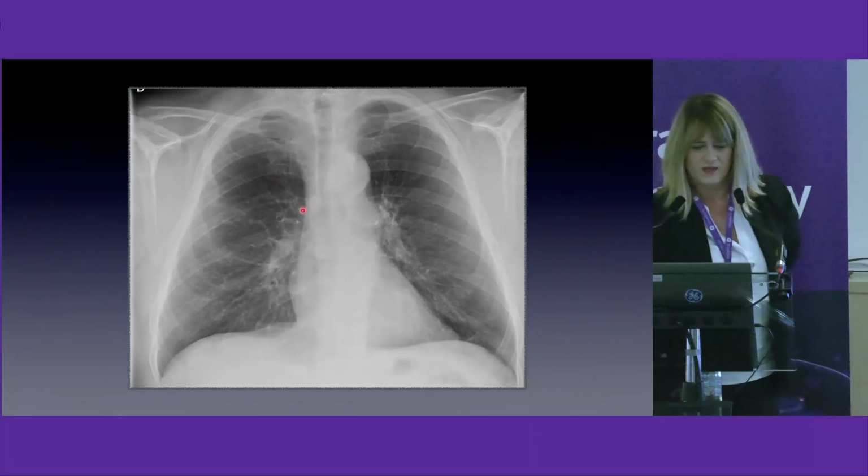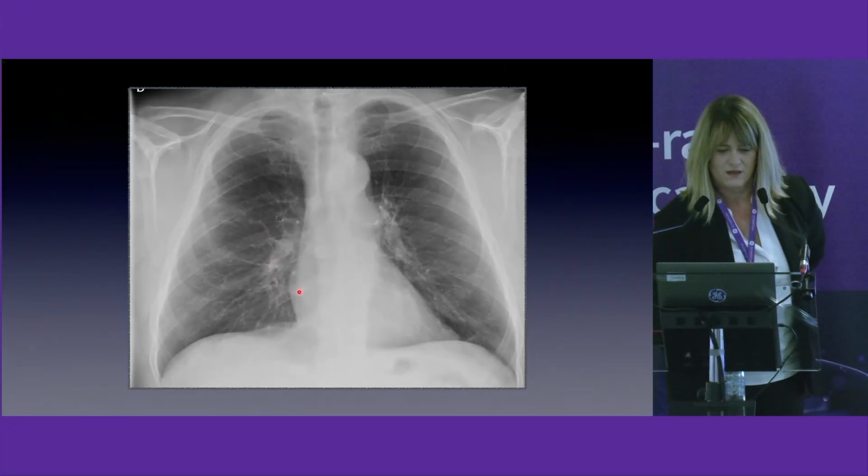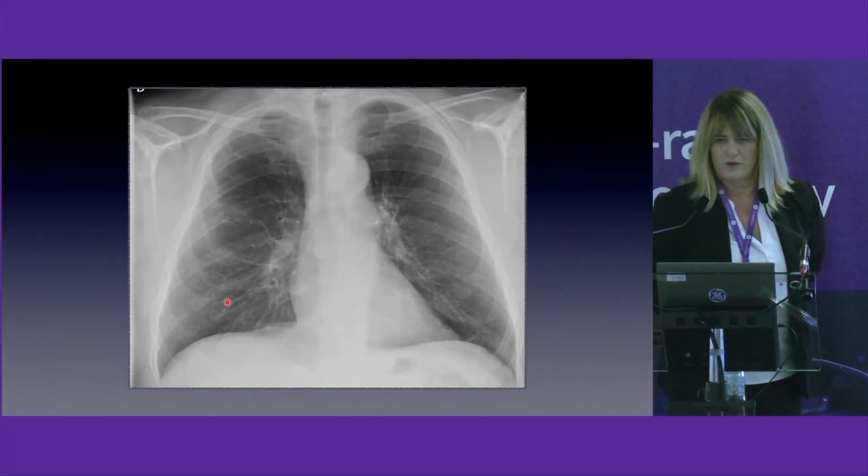So you mean this one? Here? To the base. No. Here. There. Yes. Old people, just calcified cartilage, this one. Okay.